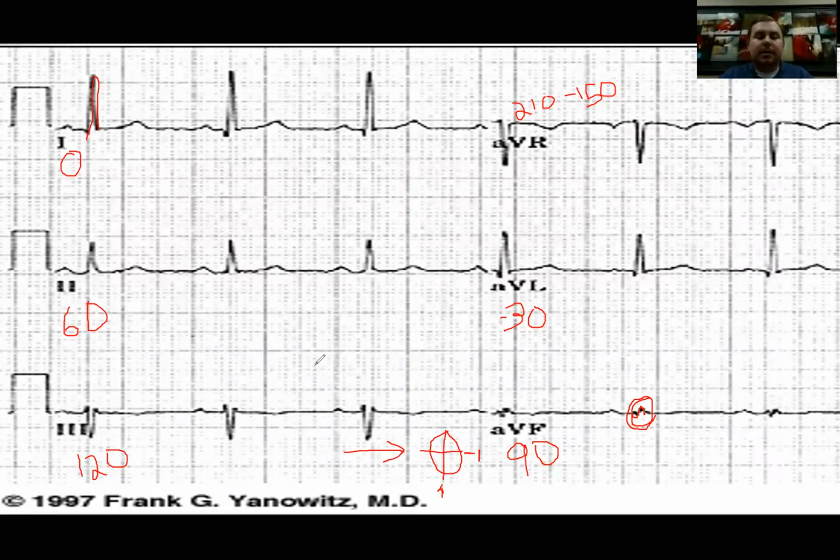And then third is to calculate what our QRS axis is. The QRS axis is 90 degrees off, or perpendicular, to this isoelectric lead. So my isoelectric lead is aVF, which sits down here at the bottom of the circle, and it's 90 degrees off of that. So that could be either 180 or it could be 0, where lead 1 sits. And you have to determine which one is the correct answer.